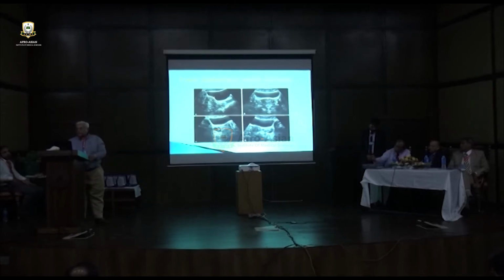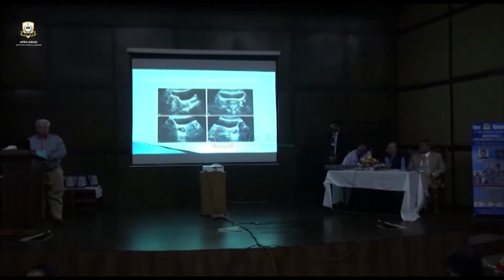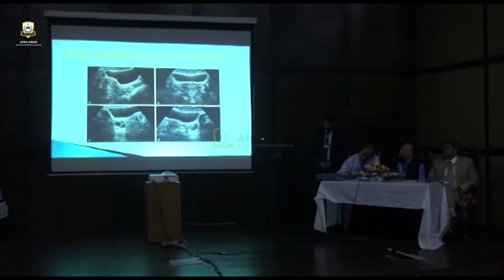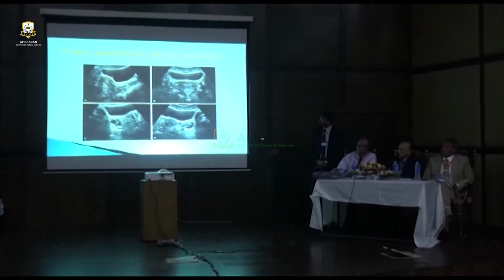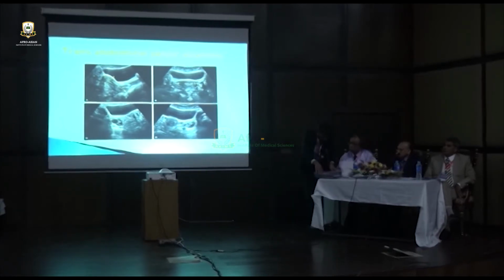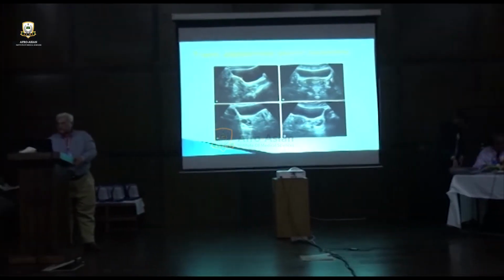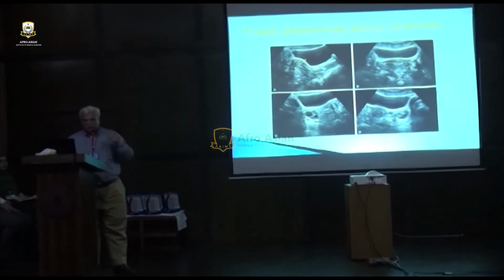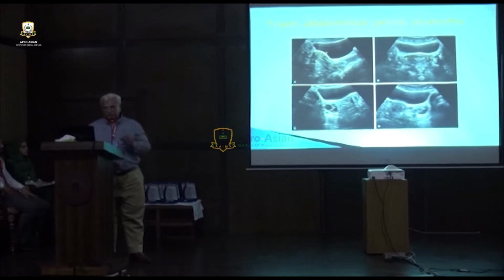So in transabdominal, the upper two images or all four of the images on transabdominal ultrasound will show you a longitudinal view of uterus with its parts of fundus, cervix, vagina, and in transverse view you can even see the two ovaries. And in addition to that, you should also follow the urinary bladder and the vessels close by.